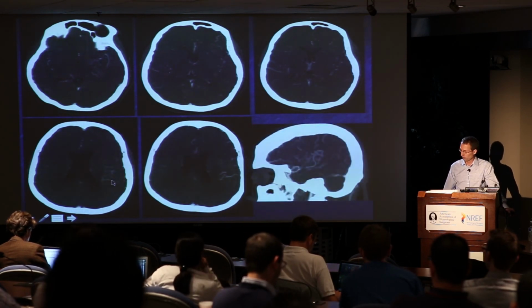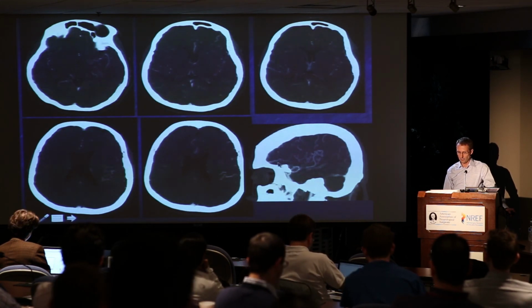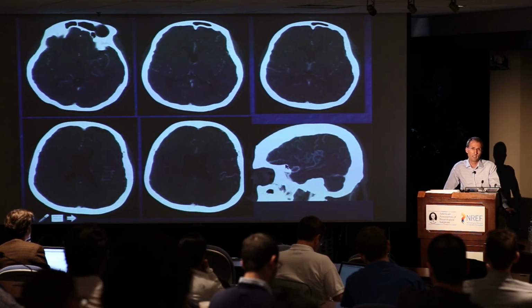The more you look, you'll see all these bizarre, corkscrewy type vessels in and around the middle cerebral branches. This is a crappy 3D reformat, but again, there are just too many little notes in here with a bunch of corkscrew tiny guys. Those should be red flags for some arterialized small cortical veins, and if you don't see an obvious arteriovenous shunt, a dural fistula should be high on the list.